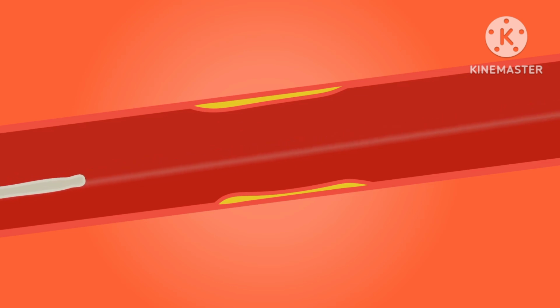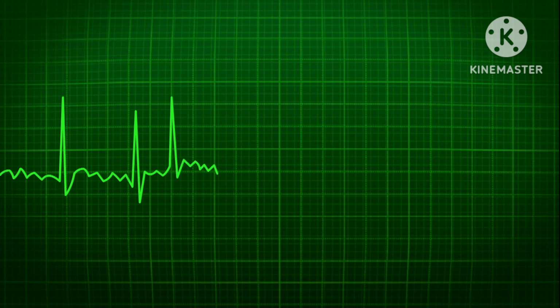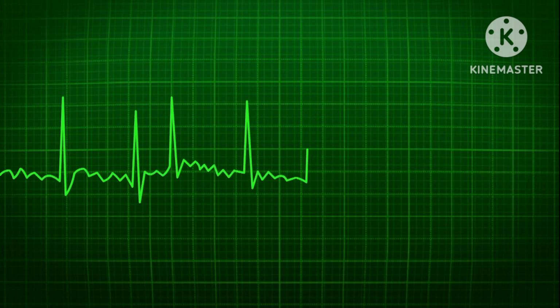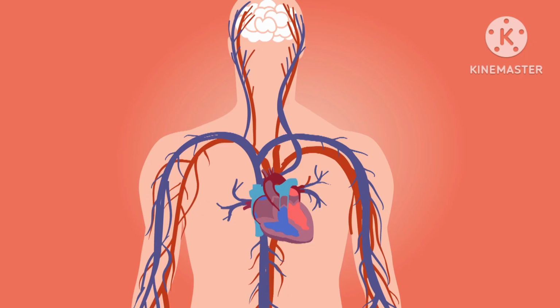Once the catheter is in place, a small balloon at the end of the catheter is inflated to widen the narrowed or blocked artery, restoring blood flow to the heart. In some cases, a stent, a tiny mesh tube, may be placed in the artery during angioplasty to help keep it open. This is called a stent implantation or percutaneous coronary intervention, PCI.